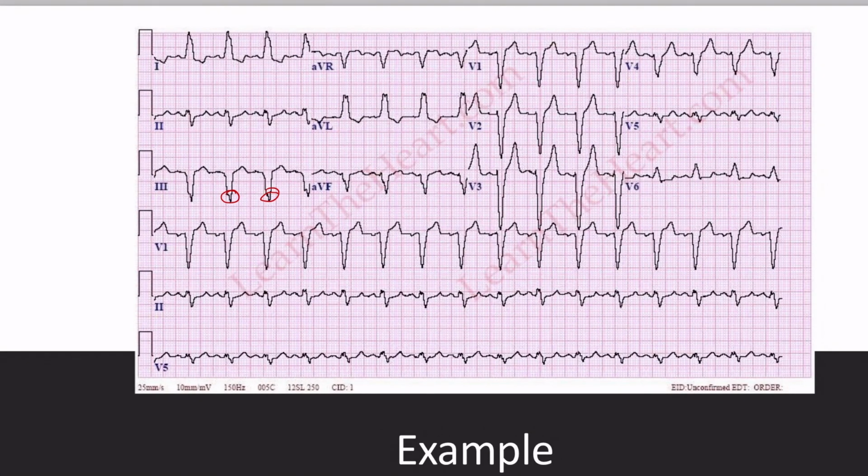Again, Takotsubo cardiomyopathy will not be at the top of your differential list. This is one of the tougher diagnoses to get. So obviously, start out with something, what's common is common. If you took a look at this and guessed that there was a left bundle branch block, it would be much more likely. But after running other tests, you might come to the conclusion of Takotsubo.